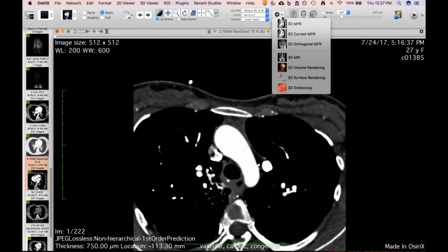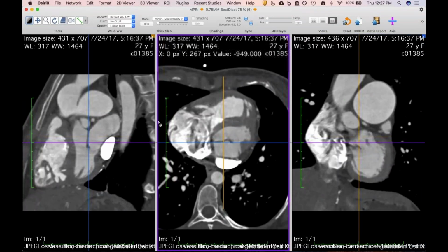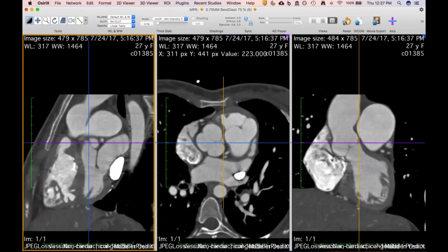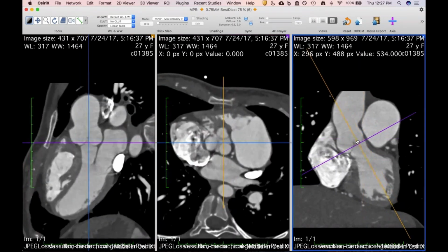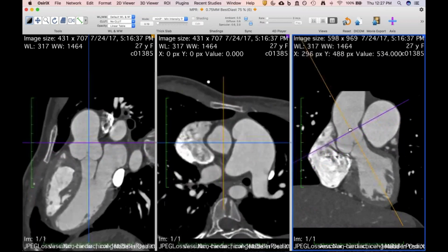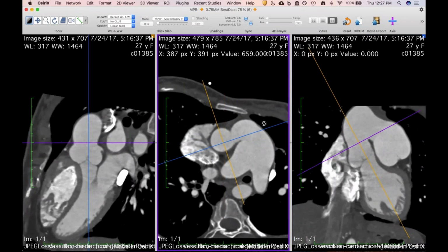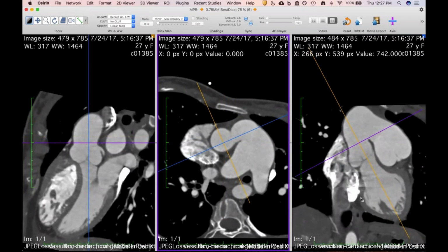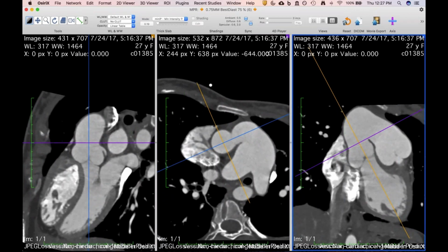farther up. Yeah, and one of the studies they did subsequently was a gated CTA, so I can actually do a nice reformat and show you exactly what the relationship is. So you can see at the sinuses it looks fine, and it's above the sinotubular junction where this communication is. Right there. Excellent. So this is the first one of these that I've seen in an adult, and usually they never even get CTs when they're infants because they just recognize this on echo and go to surgery.